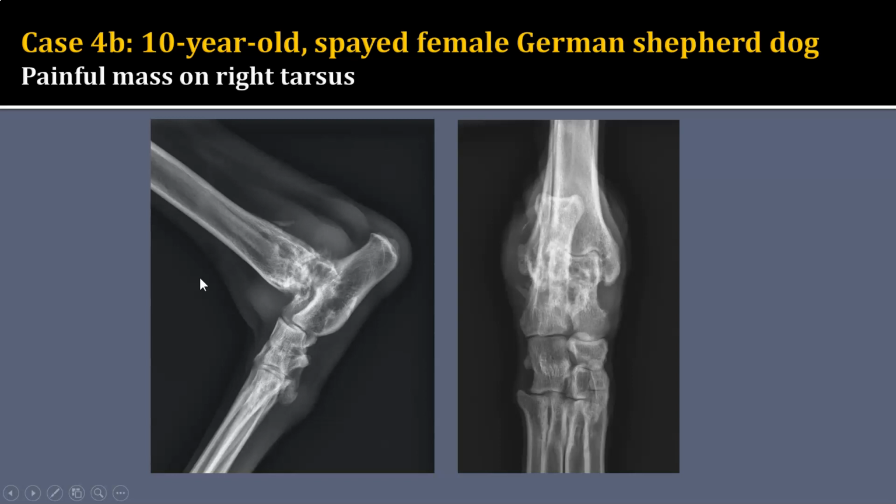Certainly another sort of soft tissue tumor is possible. Is fungal osteomyelitis possible? Sure, I think that's much less likely. And then this is not typical of an erosive arthropathy, because notice the articular margins are spared and there's no subchondral bone erosions. So again, this would fit better with a soft tissue neoplasm.